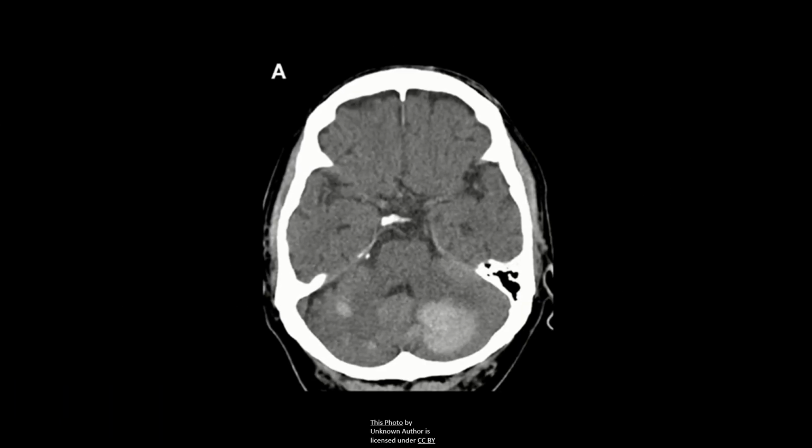Finally, we are at the level of the cerebellum. Now, the entirety of the cerebellum is supplied by the vertebrobasilar system, and just as we saw in the section above the lateral ventricle, we have thin bands of the frontal lobe which are supplied by the anterior cerebral artery. They kind of remind me of strips of bacon.